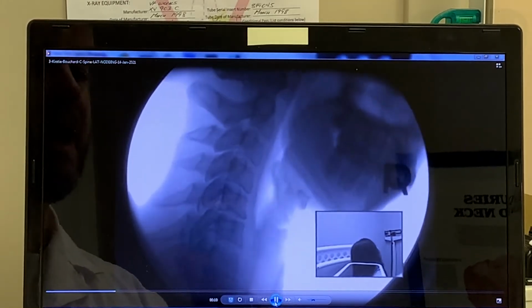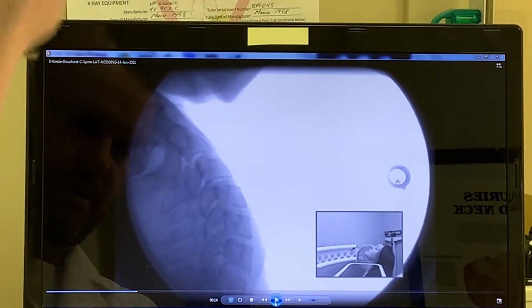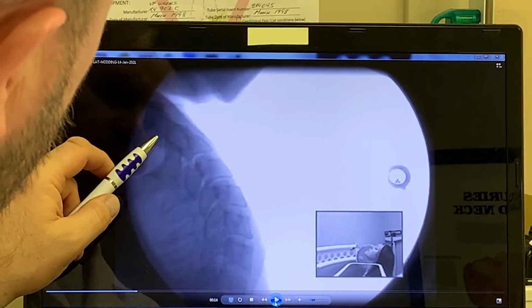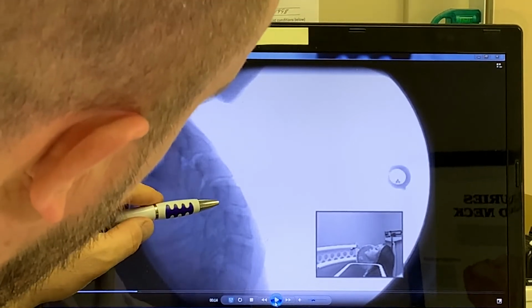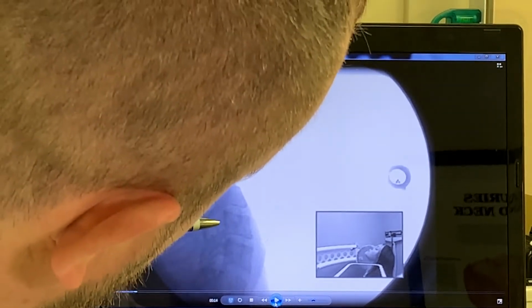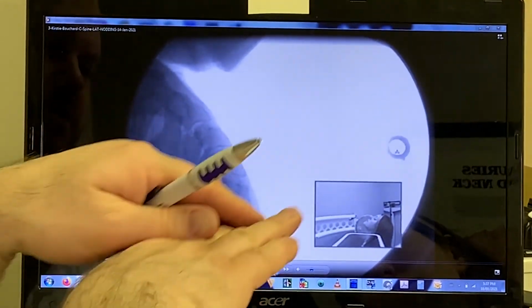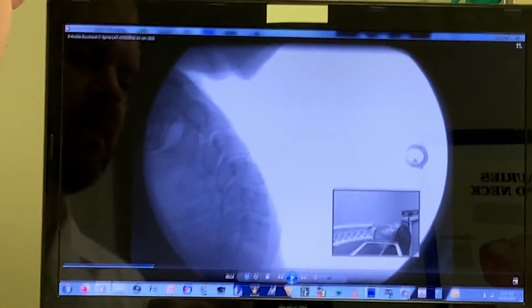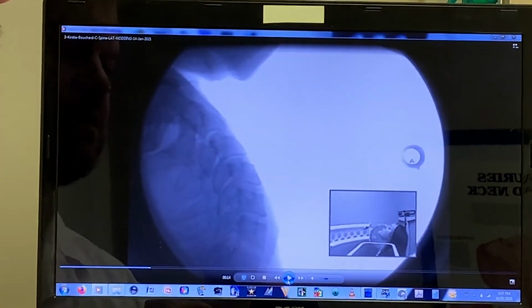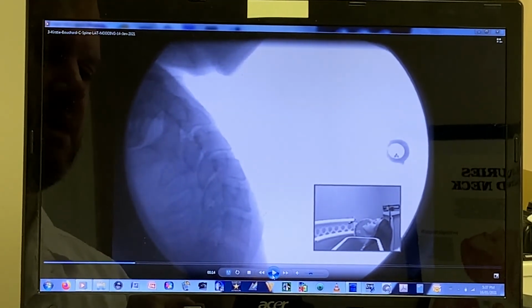And then when you go back, we're looking for the same thing. So if I freeze it roughly there, again, these two lines here do not line up, these two lines do not line up, these two lines do not line up, these ones do, and these ones do. Can you see that? Then another thing I also look for is to see if the bones are separating in the front more so than in the back, and then depending on what that angle is would delineate how severe the injury to ligaments could be.